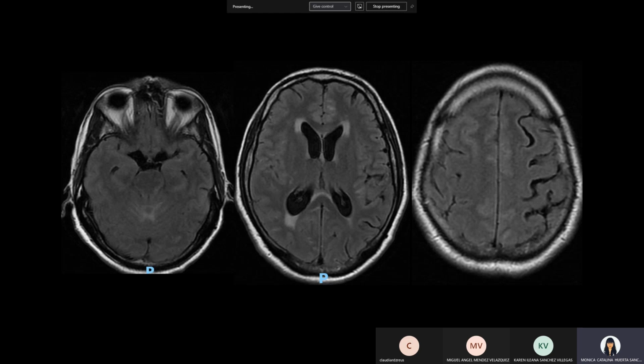So this patient had an MRI scan done after a normal CT scan, and the suggestive lumbar puncture results, mainly in the search for meningitis. So here we have three images in FLAIR sequence, where we can see an increased intensity in the basal cisterns located here, mainly in the quadrigeminal cisterns, the interpeduncular cisterns, and the chiasmatic cistern, as well as the sulci, mainly on the left cingulate sulcus and in the right superior frontal sulcus, located here.